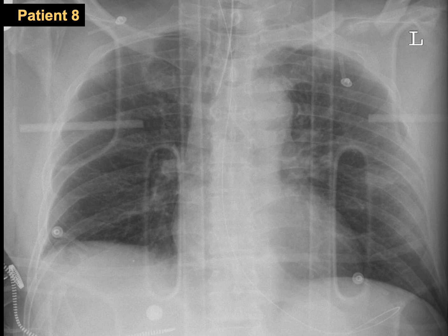Patient number 8, 20 years old, motorcycle rider who hit a tree, hemodynamically stable. Let's go for this one by one. Airway, he's intubated. Right side, B, lung is okay. Left lung is okay. And this is, as you know, the board again. A, B, C. When we go for C, I think all of us can appreciate that this is a wide mediastinum. This is more than 8 if you measure it.